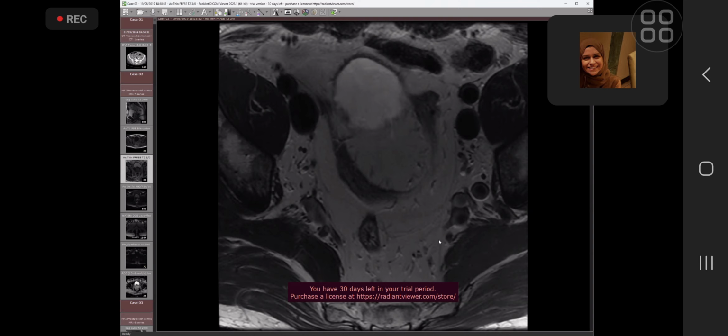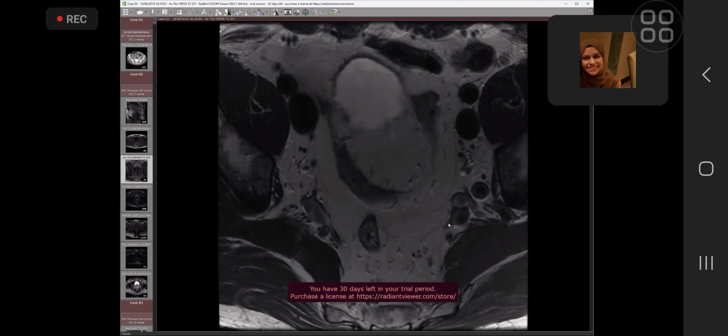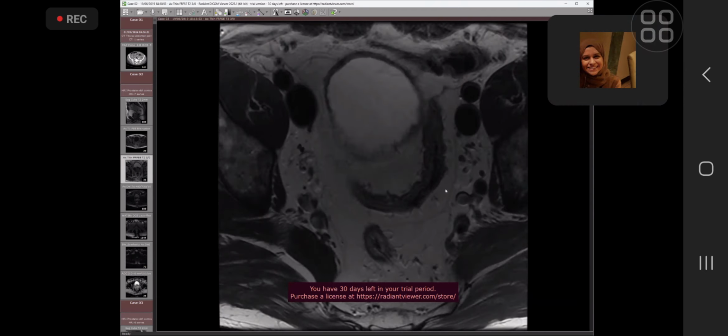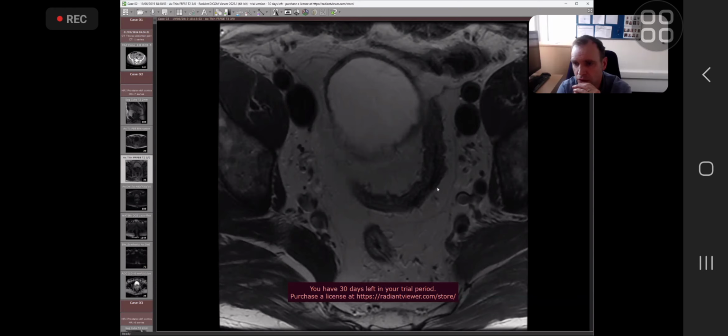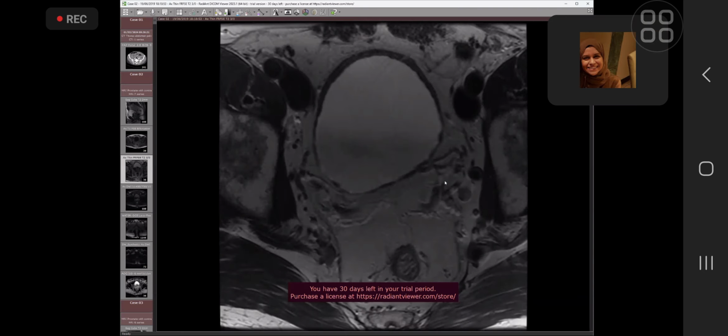This is, I think, based on what I have listened from you. Okay. Well, that's very good. So why don't you try to just scroll through on the T2? In this case, or just like I verbalize? Just for this case. Just have a quick look through.